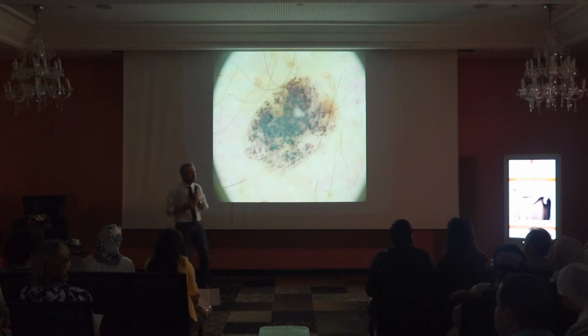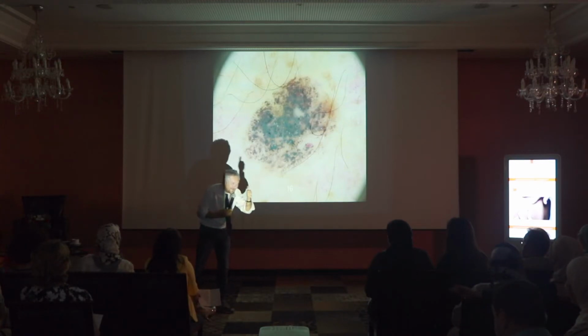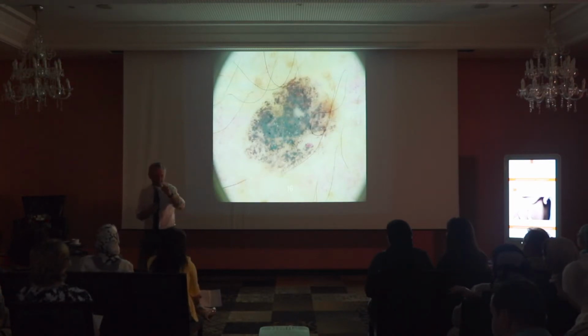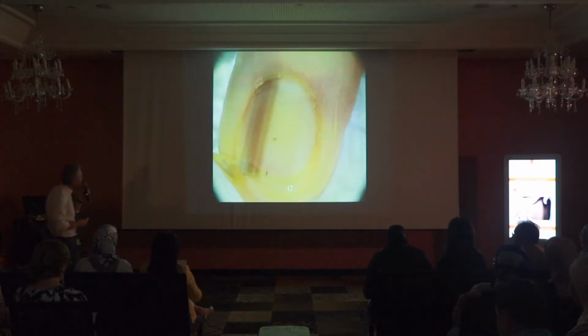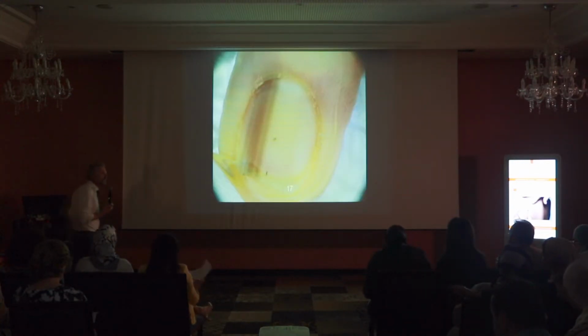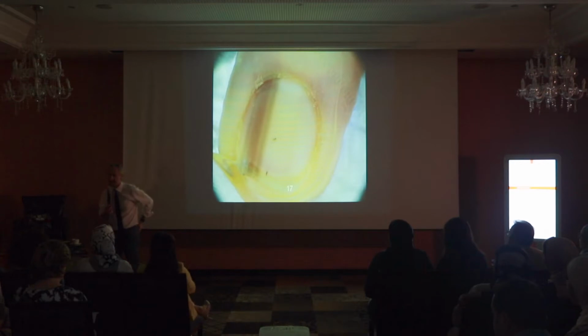So until now, this guy was found in one visit, 3 melanomas and plenty of BCCs, unbelievable. Anyway, let's go to number 17. What do you think about it? Okay, so some of you say nevus, some of you say melanoma. Of course, this is the differential diagnosis, nevus or melanoma.